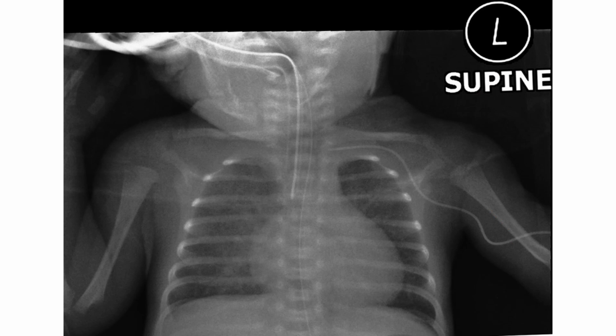Ooh, what's going on here? So nothing really going on here. We have a neonate, and this is a premature kid, and this is just a kid that's intubated. I just want to show you guys how small they are. And here, I need a more steady hand. Is their carina? So it's below the clavicles and above the carina, and this is the radio opaque line that you see here. Let me use the yellow for this. This is the radio opaque line that they put on all the ET tubes so we can see them easier on an x-ray.